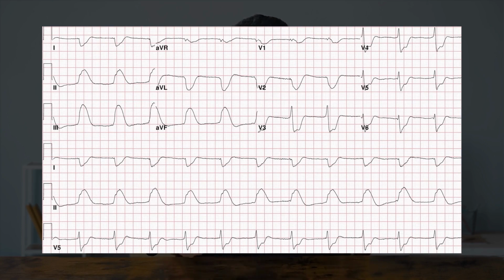He was successfully shocked out of VFib and brought to the emergency department. This EKG shows a deadly sign called shark's fin sign, which is a combination of QRS and T waves. There is a massive ST elevation in inferior leads, reciprocal depressions in lead 1 and AVL, and ST depressions in precordial leads, maximum at V2, 3 through V4. The patient has an acute inferior posterior occlusion MI.